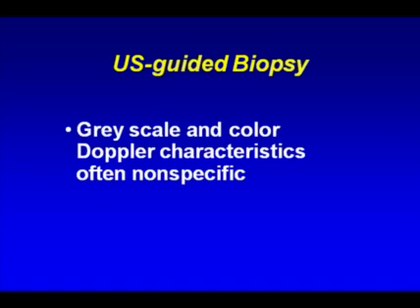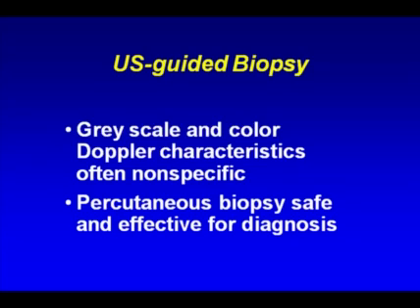Ultrasound-guided biopsy is very important in the armamentarium of the sonographer or sonologist because the grayscale and color Doppler characteristics are often nonspecific. And so when in doubt, percutaneous biopsy should be used, and it is a very safe and effective method for diagnosis.